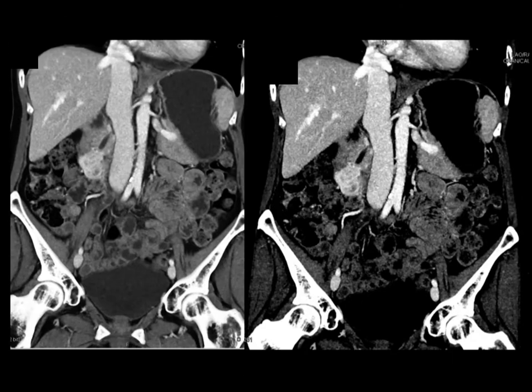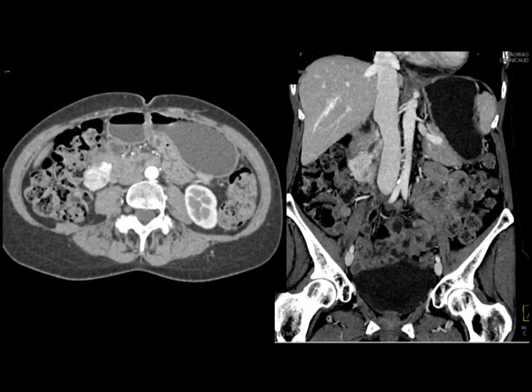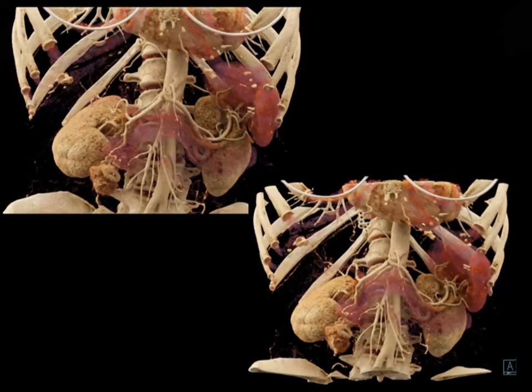Or in the same case, again, mild duct dilatation, but the vascularity. What else could it be? Carcinoid tumor metastasis, unlikely adenoCA. And here it is again with a good feel on the coronal. And then a look at the cinematic rendering showing you very nicely the extent of the patient's tumor. So again, using all of the information from the CT and post-processing gives us a better understanding.